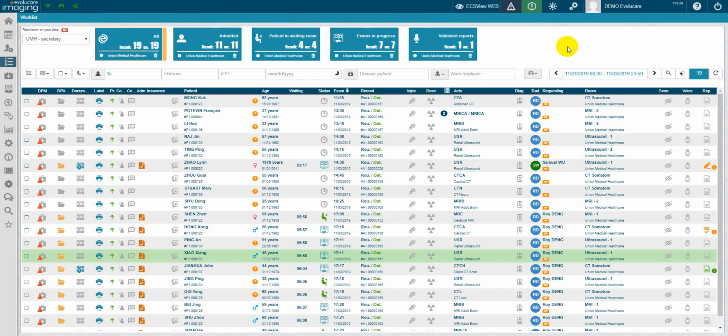First thing, showing structured information in a very fast way. Second thing, filter the information in the work list. Third thing, raise alerts whenever some thresholds are reached.